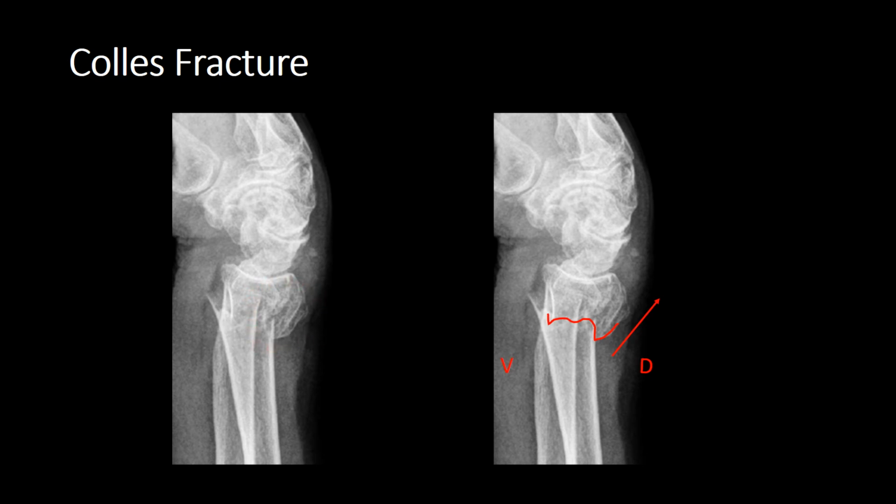by correct definition a comminuted fracture because it consists of multiple tiny osseous fragments, we don't actually use the term comminuted in our description or in your how, because when you use the term comminuted, the orthopaedic surgeon is expecting to see very large bits of bone, which they will have to put together in the correct alignment to fix the fracture site to the correct position.